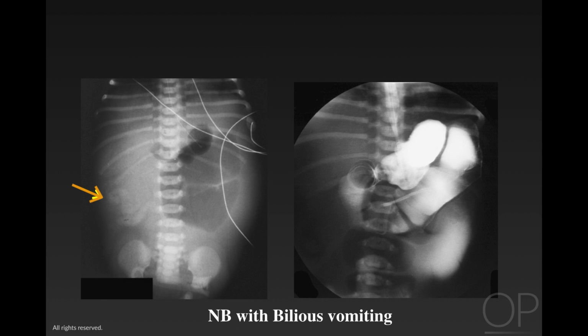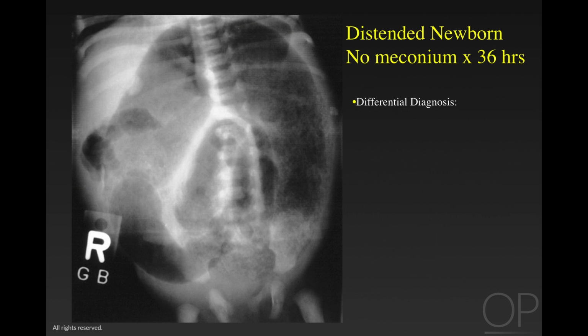We've seen this baby before with a loop of calcified bowel in the right flank and a gasless distal abdomen with focal dilatation of 1 proximal loop of bowel. By giving positive contrast, we see that there is marked dilatation of the jejunum related to a child with jejunal atresia and a focal ischemic loop of bowel in the right flank.